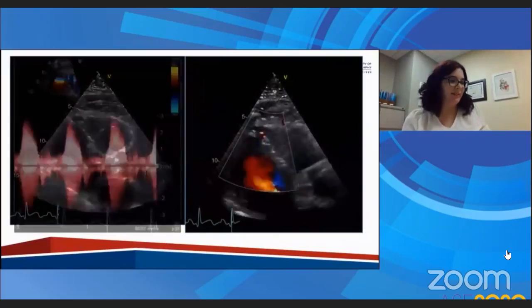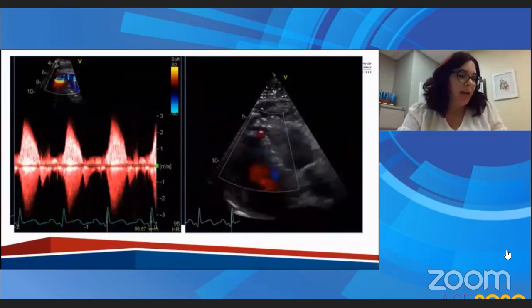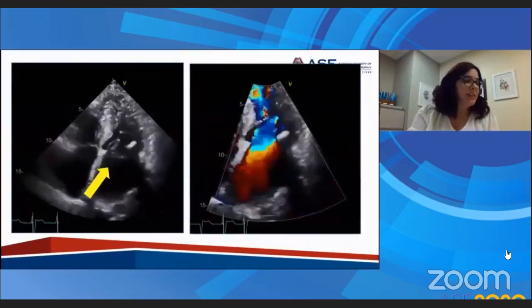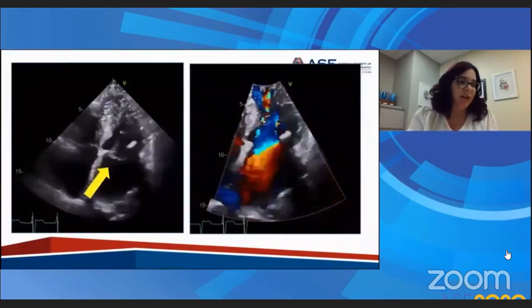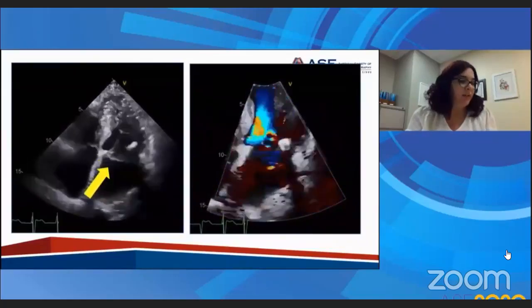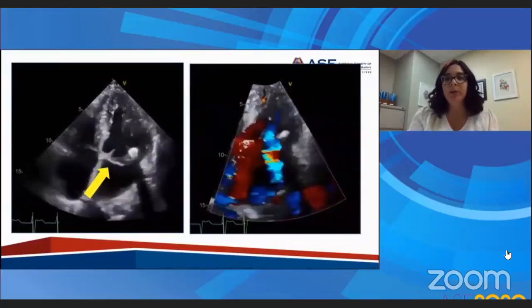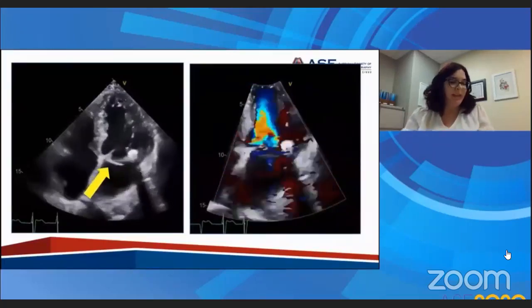Next slide. This patient's apical wall ruptured at the apex, causing a large left to right shunt. Next slide. So the position of the wall motion abnormality when evaluating function is very important when understanding what mechanical issues may arise. For this patient, there was not a wall rupture, but instead a post-MI papillary muscle rupture producing severe acute MR. Next slide.